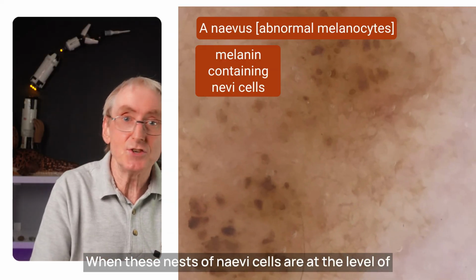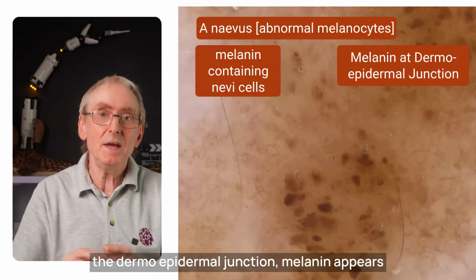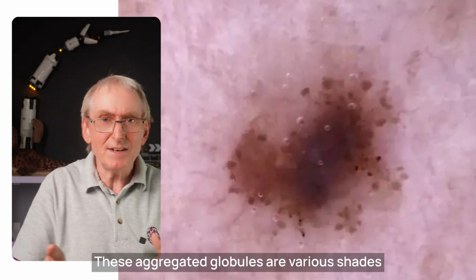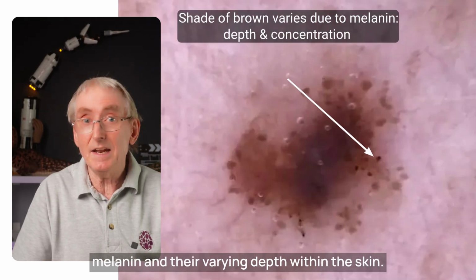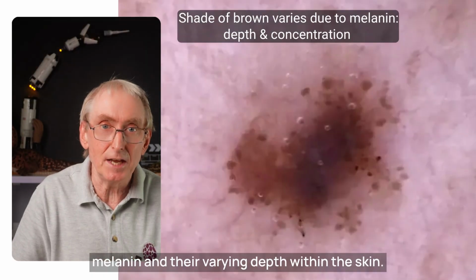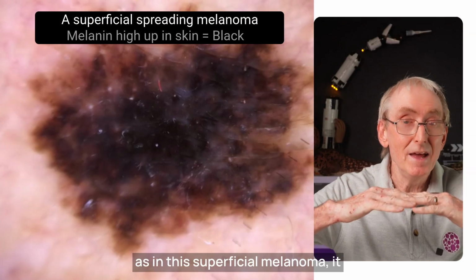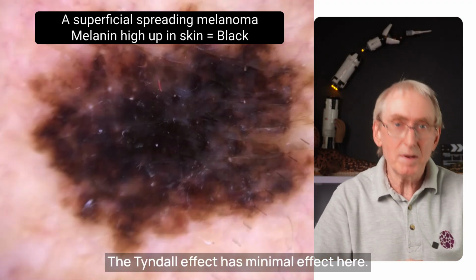When these nests of nevi cells are at the level of the dermoepidermal junction, melanin appears in various shades of brown. In an atypical nevus, these aggregated globules are various shades of brown due to different concentrations of melanin and their varying depths within the skin. When melanin is more superficial, as in this superficial melanoma, it appears very dark brown or black. The Tyndall effect has minimal effect here.